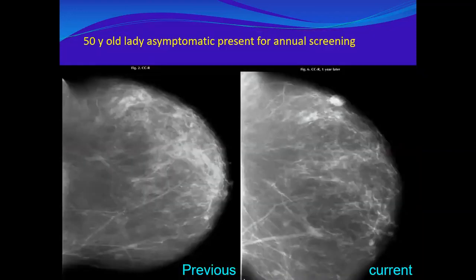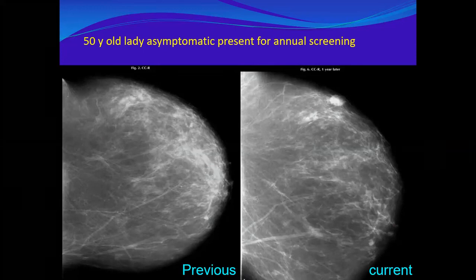Okay, next patient. Time passes quickly. This is straightforward now. I need from you, even without telling me where exactly, just whether there is asymmetry or not, and what type of asymmetry.